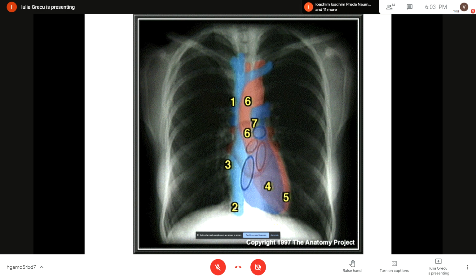So three venous structures that determine the three arches on the right side of the mediastinum. The first and superior is the right brachiocephalic vein. The middle one is the right atrium, and the most inferior and the third one is the inferior vena cava, not always seen.